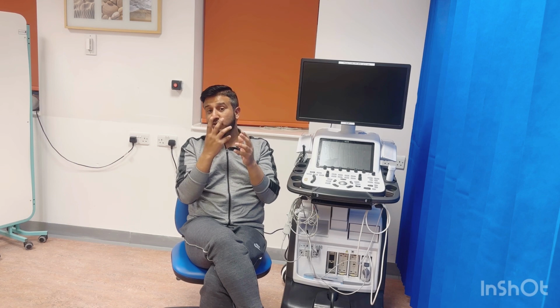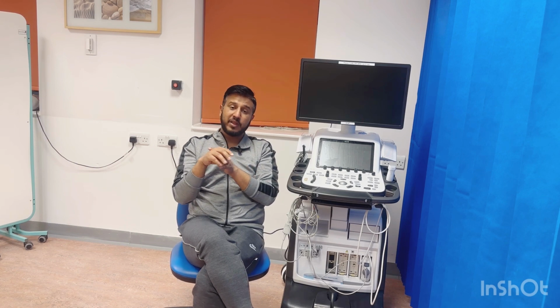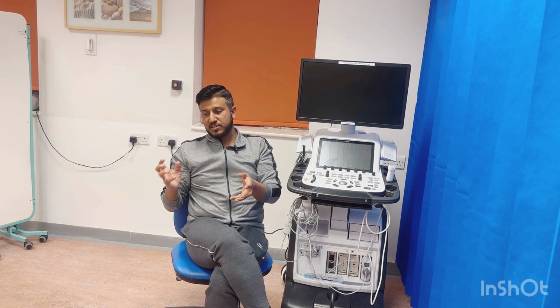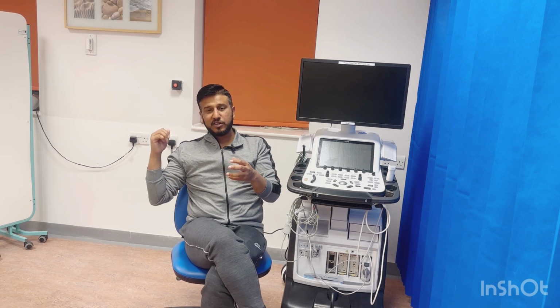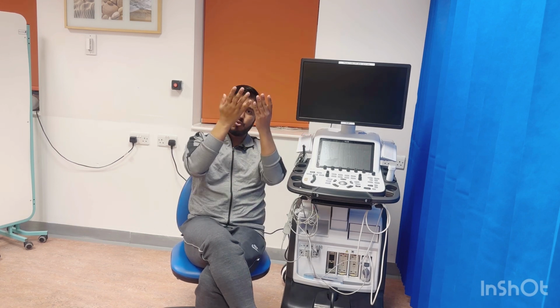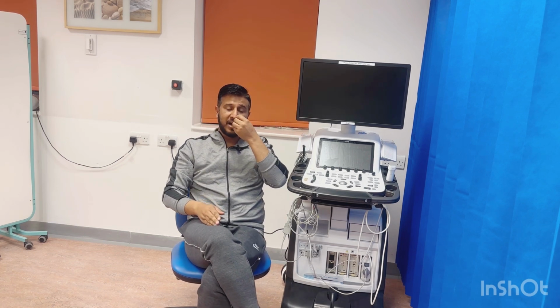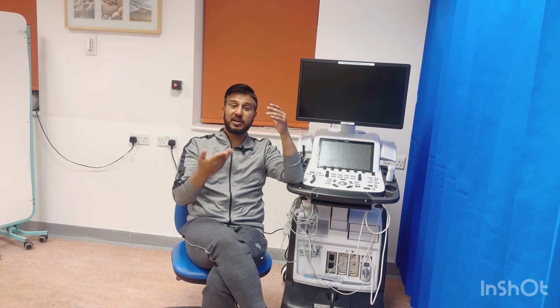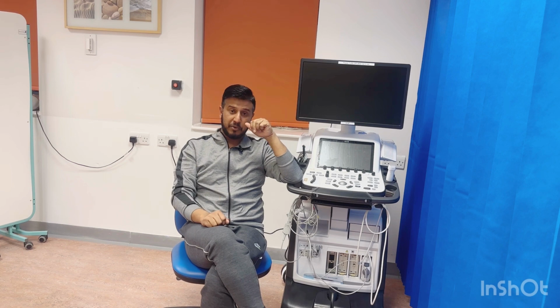It could happen in two ways. One is that the aortic regurgitation is actually very severe, so as soon as diastole starts, a lot of flow goes from the aorta to the LV, and the LV pressure goes sky high, and we see a very steep pressure half time, which gives an impression of severe aortic regurgitation.